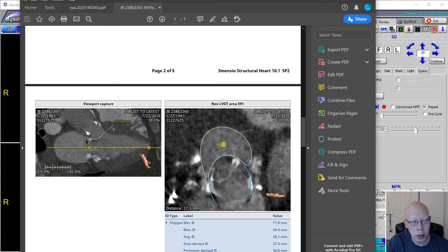The mechanical struts, or the stent that the new device will have, look roughly 2.5 centimeters. We can get exact dimensions, but they do try to seat the device on the existing bioprosthetic valve. So this is a valve-in-valve procedure, just to be clear.